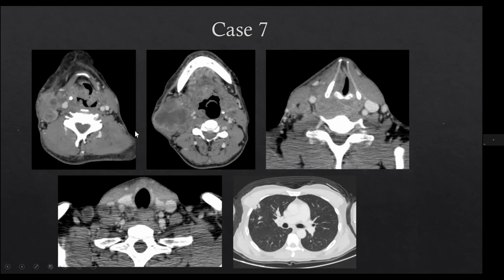Not only is the disease extensive, the nodal involvement is also quite extensive. There are large necrotic nodes with a necrotic nodal mass at level 2, 3, which shows extranodal extension and partial encasement of the vessels on this side. So basically, we are not able to identify these. These are the vessels on the left side. The IJV is not at all identified on the right side.